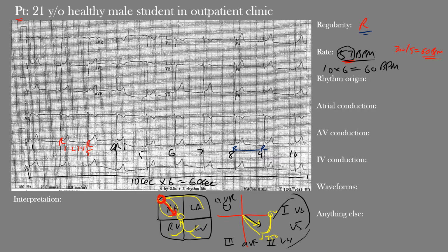We'll look at lead 2, one of our inferior leads. Again, a little hard to make out our P waves there. There's one there, you can see it. Let's just erase so you can see that. So there's a P wave. Again, hard to make it out in 3, maybe one right there in AVF. V1, can't really see, but how about those left lateral leads? Here's a P wave here, here in V5, and there's another one there. And then in AVR, we said it would be negative, and there's our negative P wave.